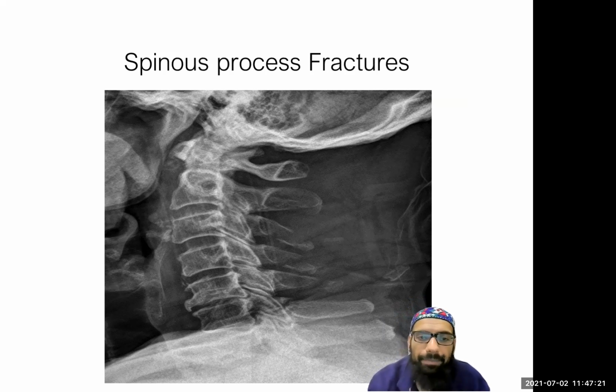Right. And when we come to the posterior line, that's when we actually notice the spinous process fractures that are occurring here. So it takes quite a bit of force to fracture the spine. And it takes quite a bit of force to fracture the spinous processes in and of themselves. Okay, so this is the type of patient also that may well present with severe pain. As you can see, there's a loss of lordosis. These patients also deserve a CT of that spine. They deserve to have their spine immobilized and for an orthopod to have a look.